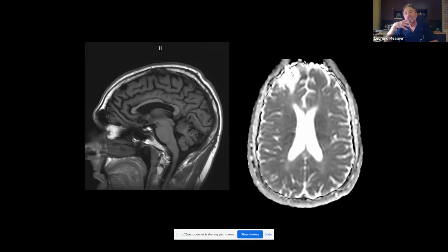The most common is a tumor, such as a pituitary adenoma, Rathke's cleft cyst. Sometimes we see these with suprasellar meningiomas, but you can get these with trauma as well. My point to you is that when you see this binasal thinning, think of something going on within the chiasm.